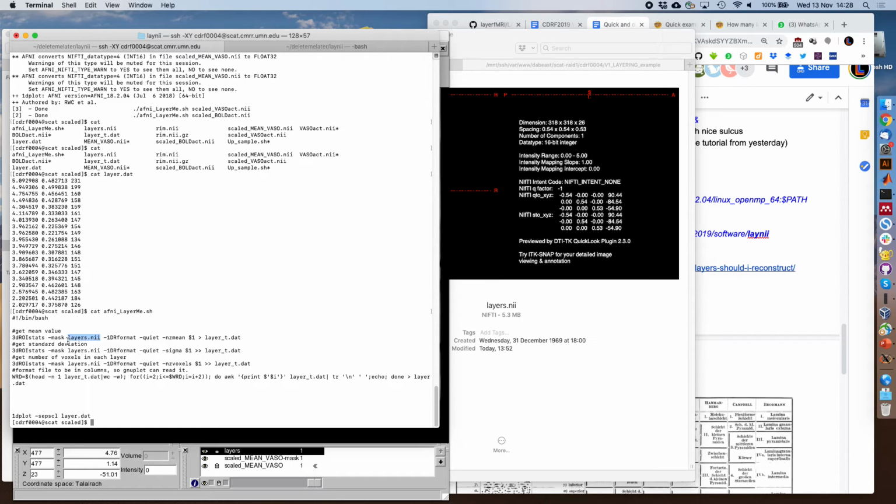Okay, sure, I agree. But now, how does that relate to the number of layers? Because when you've got 30 layers, it's a lot easier to visually see it than if you only compute 5, right? Then I would go for 30.